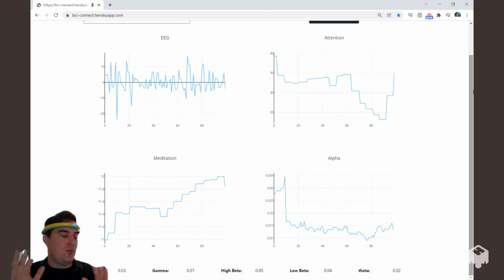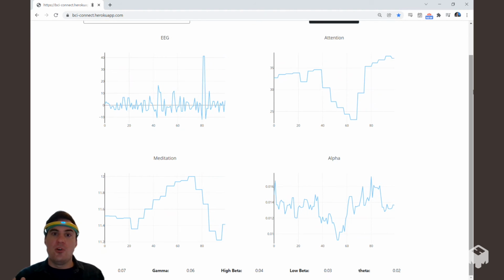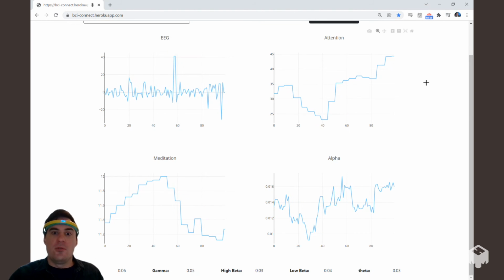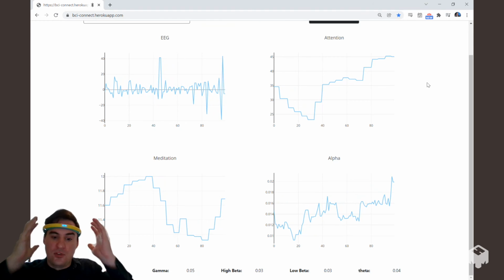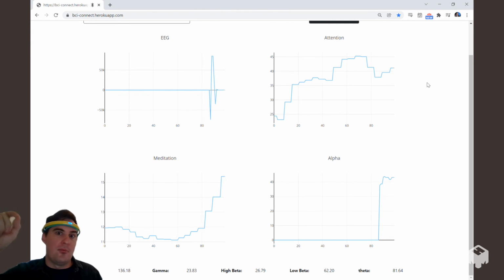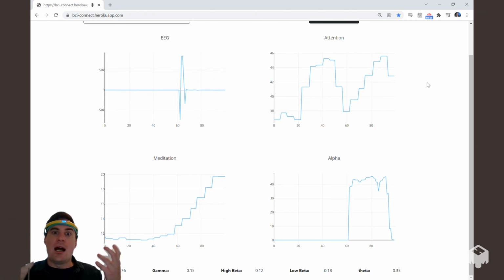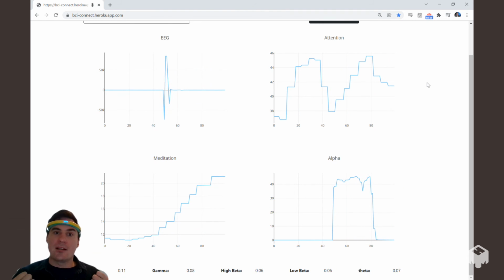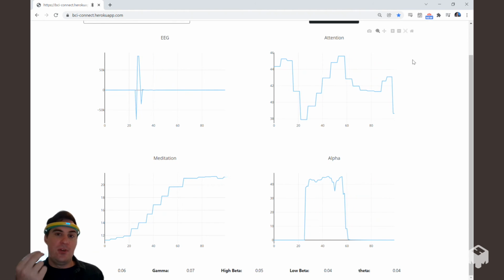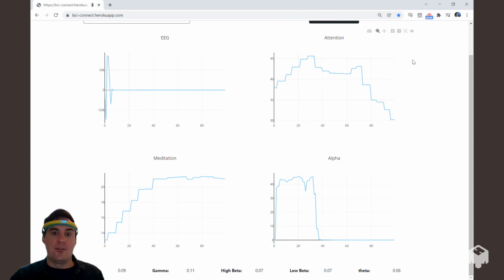What that means, we have plenty of information on our website and within our curriculum, but just for the moment now, think if your mind is blank, this attention number is going to go down. If your mind is super engaged in something like a hard math problem or something else like that, this is going to go up. So I am really good at making myself disengaged. So I am going to relax and I'd like you to watch this attention metric go down. So ready? Let's see if we can make this attention metric through our BCI on Chrome come down. So let's take a look.